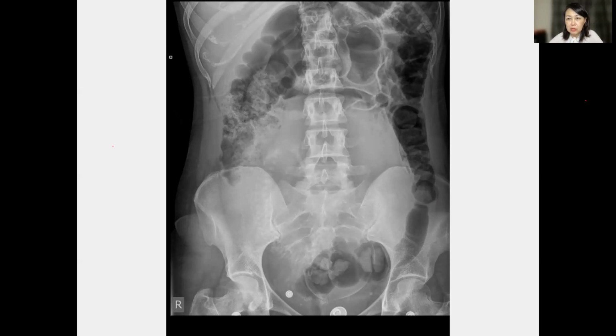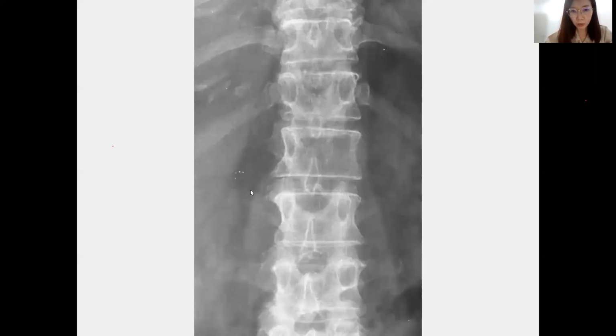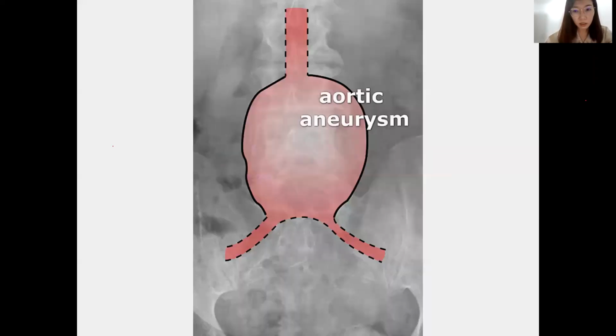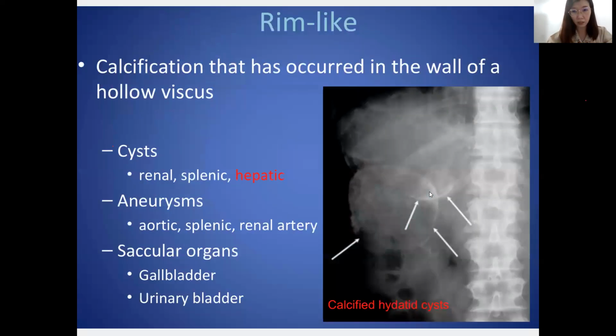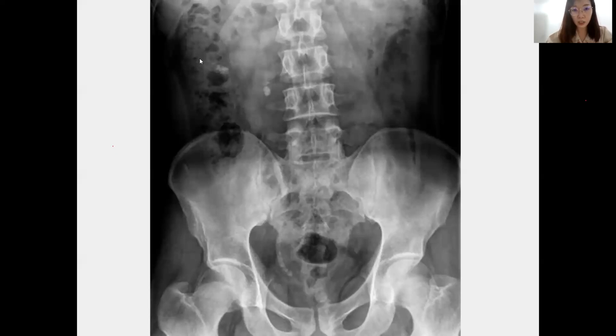So there's a gravid uterus, right? You see all the bowel already displaced peripherally, and you see the opacity here. If there's some mass in the center of the abdomen, the bowel will displace peripherally. Let me go back to the previous slide. On this X-ray, you will see the distribution of the bowel loops: peripherally is the large bowel, centrally is the small bowel.